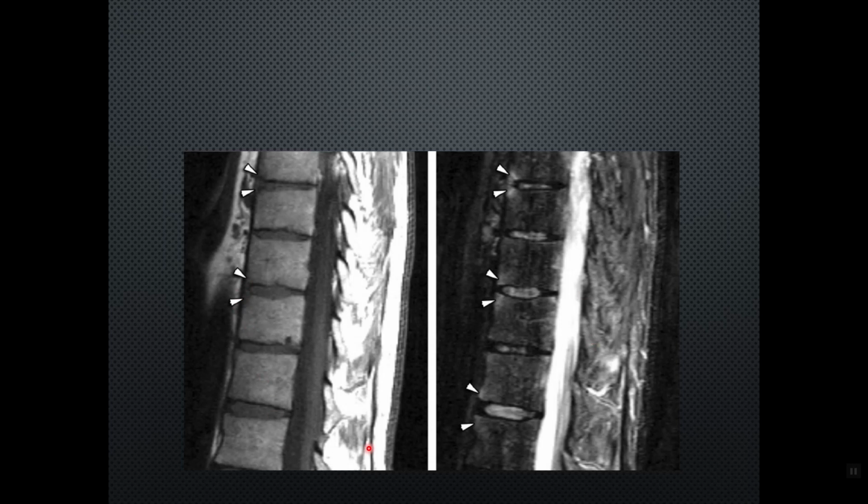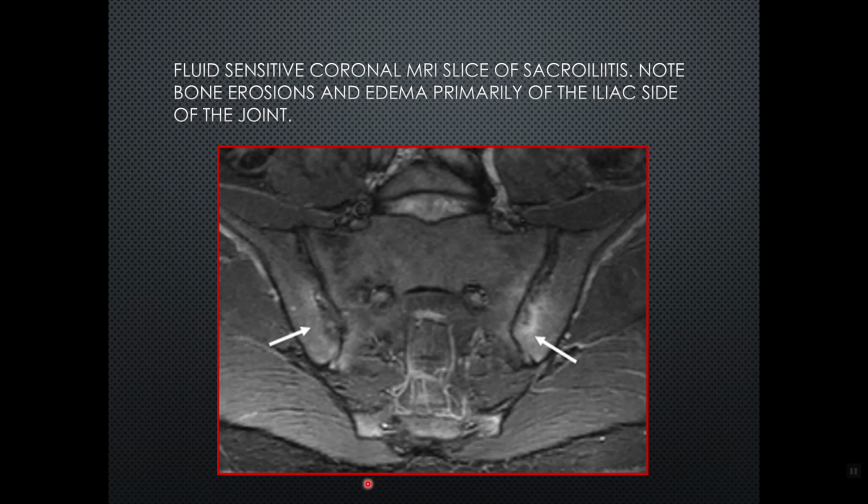And again, if radiographic changes in SI joints are not clearly demonstrated and the clinical suspicion is great, then MR of the sacroiliac joint may be very, very helpful. And in this case, you can see that reactive edema in the sacroiliac joint. Of course, here you also see that irregularity or erosive changes in the bone of the sacroiliac joint. Bilateral sacroiliitis. Again, spondyloarthropathy high on the list, particularly ankylosing spondylitis.